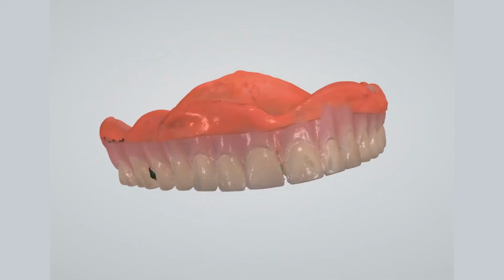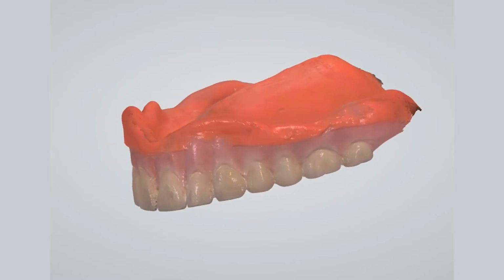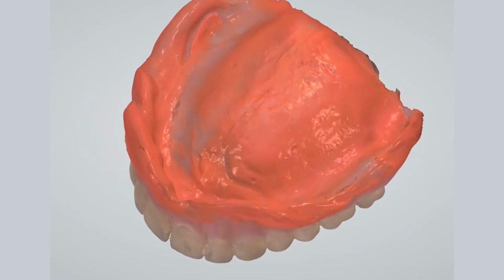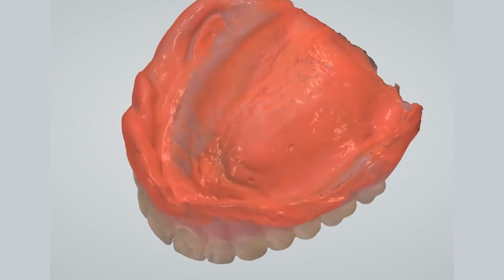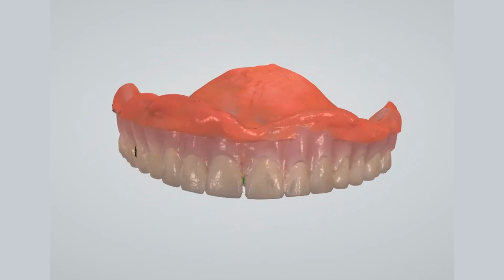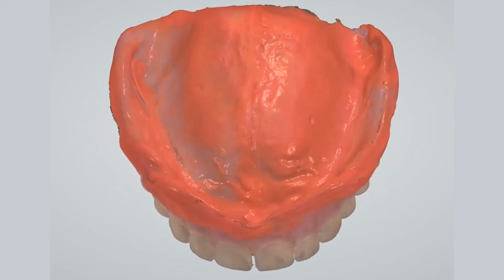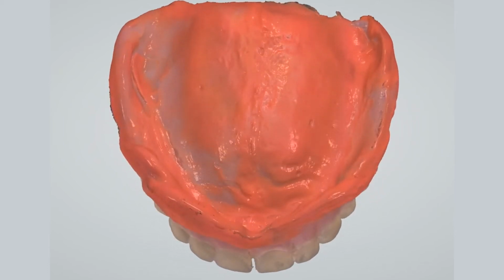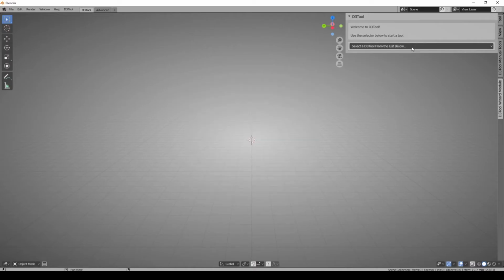Another unintended indication that I feel like people may use for this would be in emergency situations. If a patient had a broken denture or something like that, in a pinch, you needed to create something monolithic to get them by temporarily. And this would work then, but the intended workflow is for doing try-ins when you're fabricating that final complete denture. So we'll get to it.